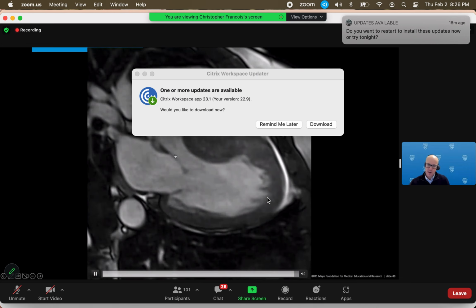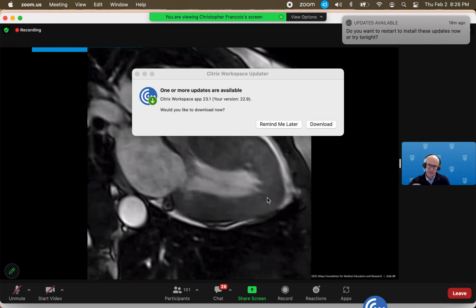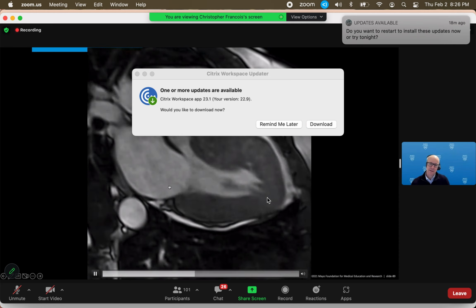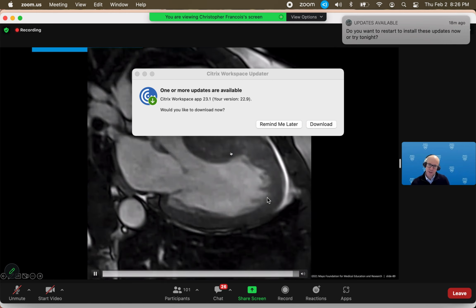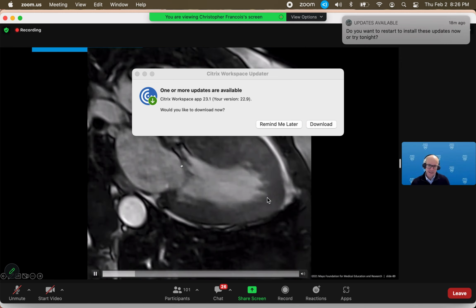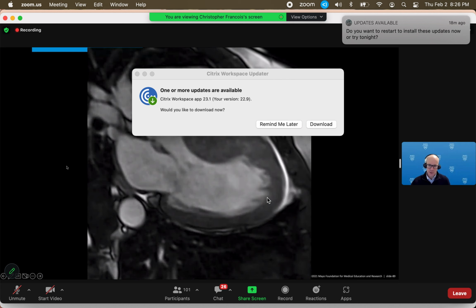This is also causing the anterior leaflet of the mitral valve to move anteriorly, so that's what we call systolic anterior motion of the mitral valve leaflet, giving some mitral regurgitation posteriorly here. So hypertrophic cardiomyopathy. In this case, we would call it hypertrophic obstructive cardiomyopathy with LVOT obstruction, systolic anterior motion of the mitral valve, and mitral regurgitation.